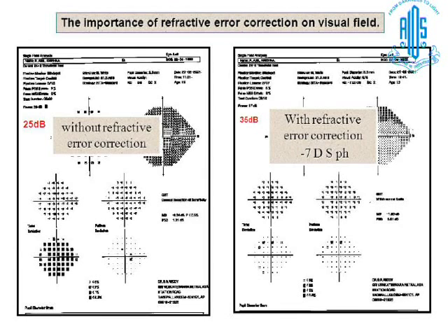And this patient is taken with the field without correction. I know this patient had 6/6 vision. See, the foveal sensitivity is 25, because the field was taken without correction of a -7 myope. He had a uniform total depression, and when the correction was given, the fields became normal.